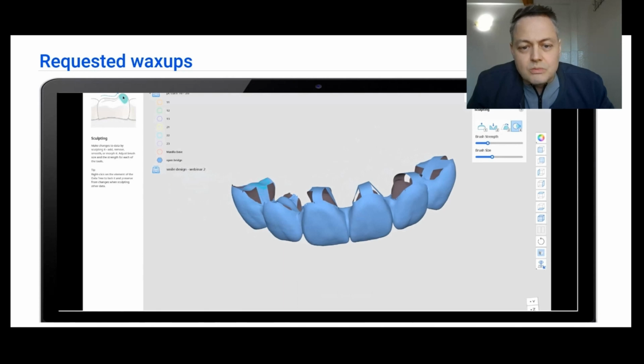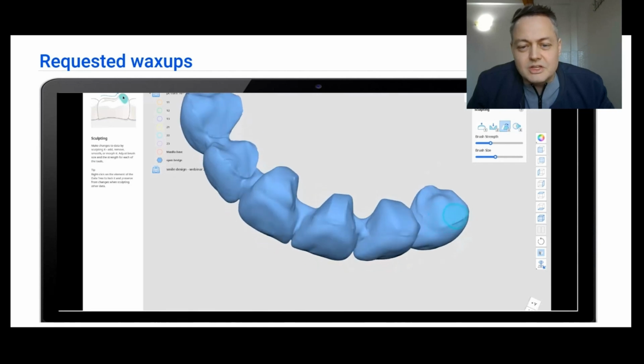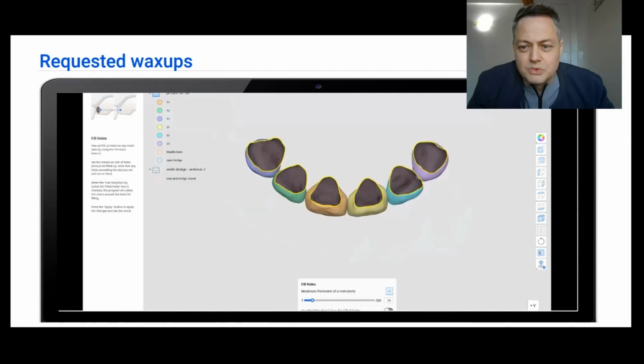If not, you just go back one step and start pulling on these lines you've just created, then close the holes and just smooth a little bit on the edges to not have rough spots, as you can see in the image. After everything is smoothed out, you will go and merge the model.